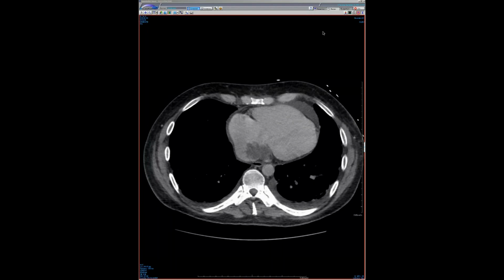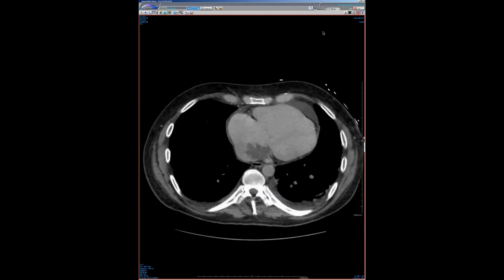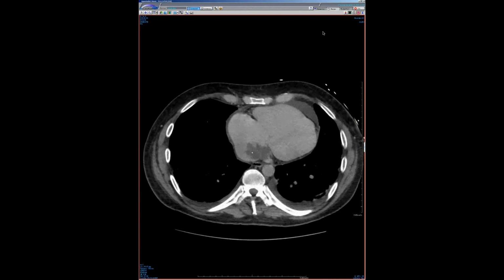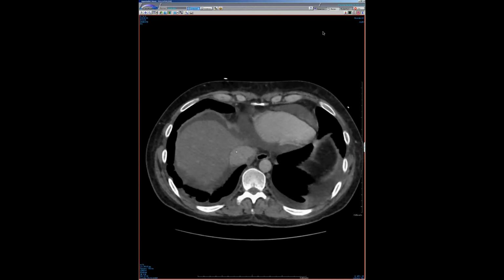If you hold on 1 second, I will pull over his echo. So this thing is very lobulated. It's going through the Thebesian valve into the coronary sinus. It's actually also going across the Eustachian ridge into the IVC. You can see his IVC is quite dilated, or his hepatic veins.